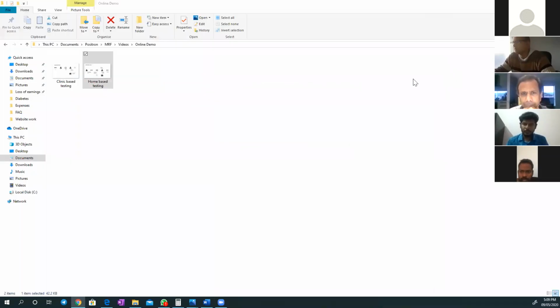Okay, guys, so this is a training to basically show you how to use the online system for doing visual fields and visual function testing. So I just want to show you a couple of pictures before I jump into showing you the actual online system. So I just want to check, can you see my screen right now?